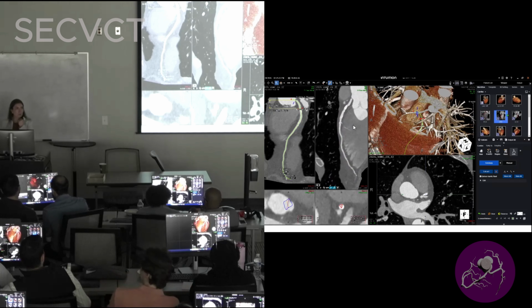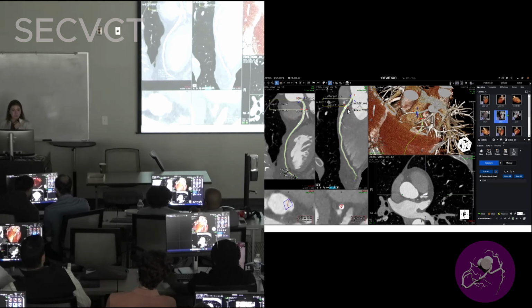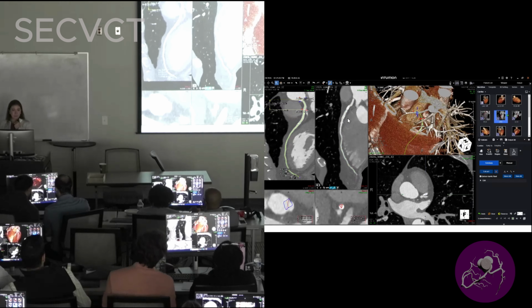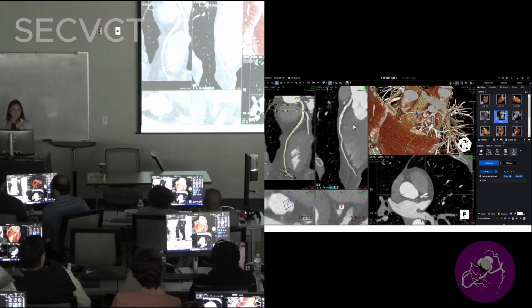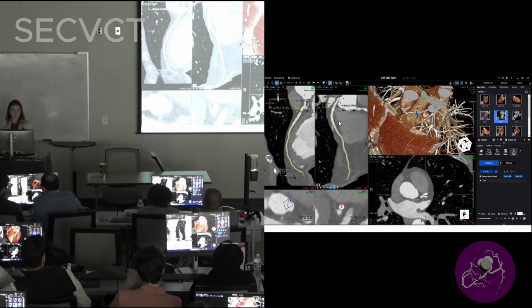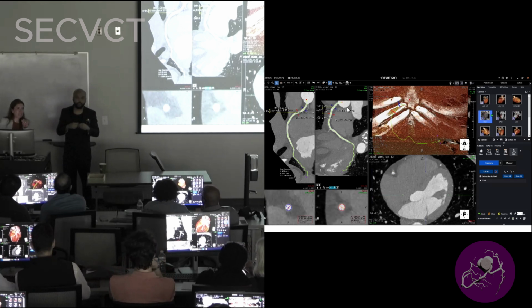Okay, so I'll go ahead and tell you what I'm seeing here on my LAD reconstruction. There's some calcified plaque here where I'm looking, and you can see that lumpy, bumpy outer lumen to the vessel all throughout the mid here. So now we're going to be interested in this area here. So this is CAD-RADS 2.